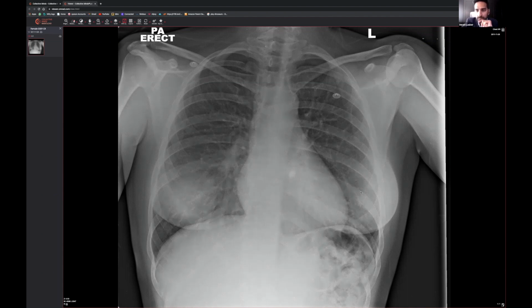Okay, hang on. Sure, yeah. So we've got an adult patient over here. You may be able to see that, yeah, so someone has said that they've come in with chest pain.